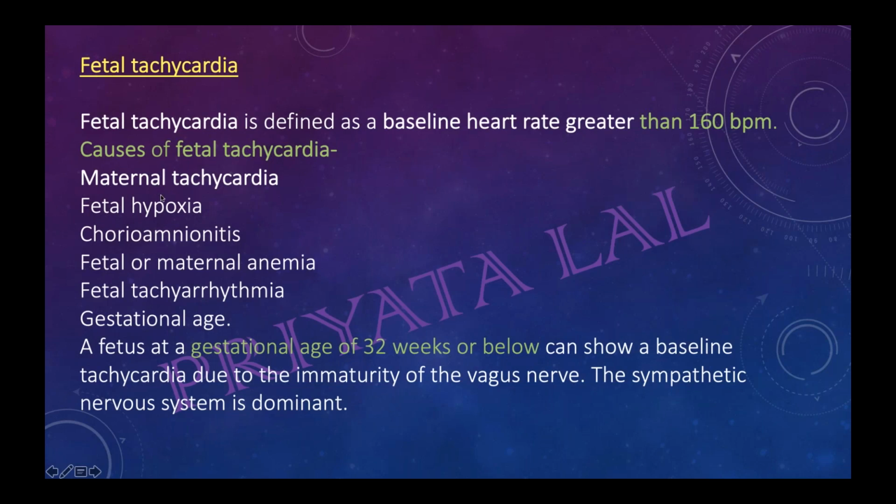One thing is maternal tachycardia. If you get a trace on which maternal pulse is there, you'll be able to find it. Other causes are fetal hypoxia, sepsis, chorioamnionitis, anemia, fetal heart problem, tachyarrhythmia, and gestational age.